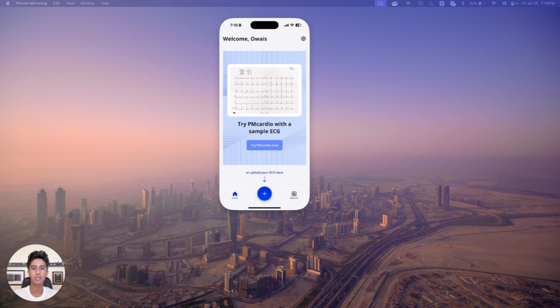It also can, like I mentioned, interpret other conditions like AFib, and flag you for things like hyperkalemia. Apparently it can guess ejection fraction, which is one of the tools it has as well. Now, because I'm screen sharing, it won't let me take a picture, but I've used it to find example EKGs with various conditions, STEMI obviously being the one I'm most curious about, and it's been pretty impressive.